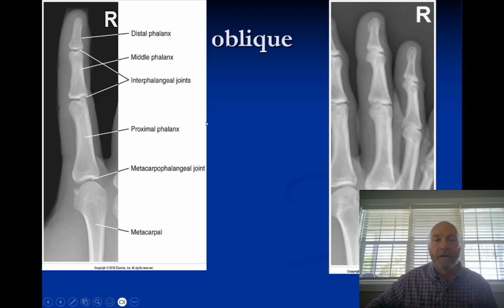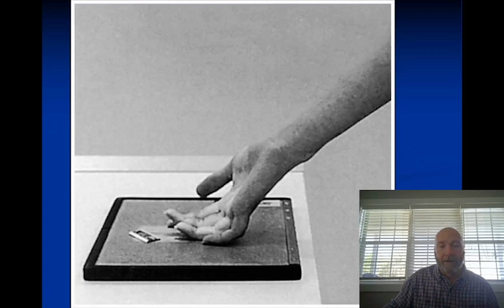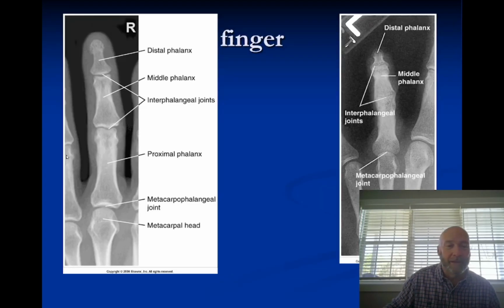All right, so on obliques, this kind of illustrates what I was talking about before. We've got an oblique, and on the posterior side, we've got pretty much a flatness. So from the AP, let me go back to that. On the AP that's not completely torn up, you can see that you've got kind of that hourglass shape.